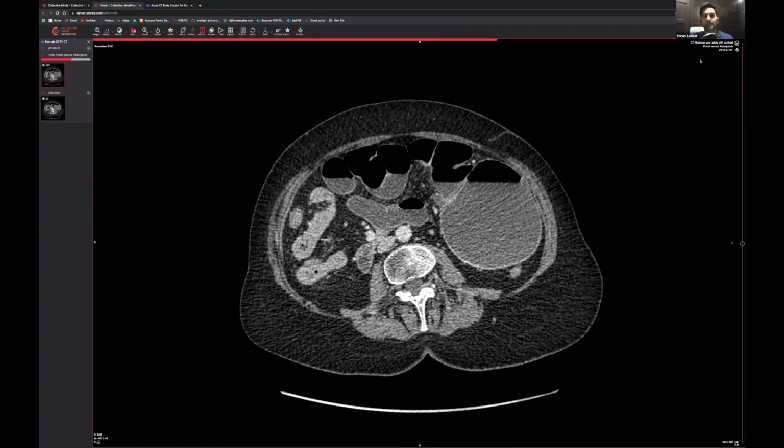So I would really like people, if possible, to just have a look at it and just quickly scroll through and just say what you think it is. Just give me a guess. It doesn't have to be right. It doesn't matter. We're all friends here. Nothing to stress about at all.